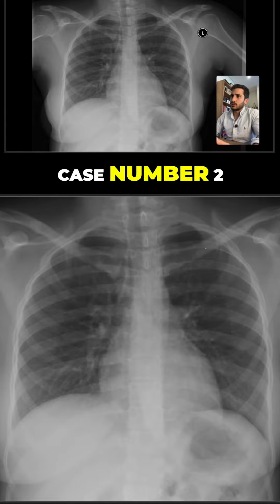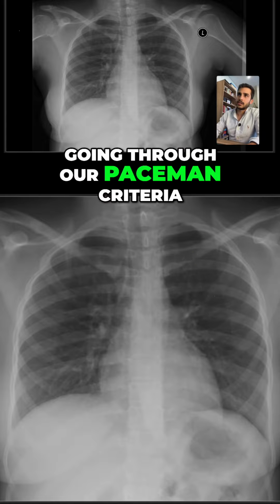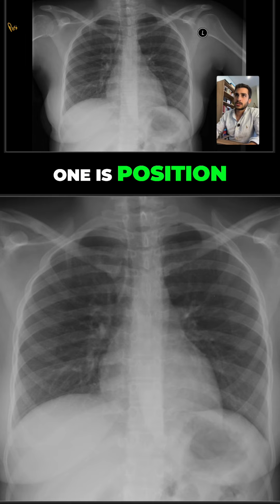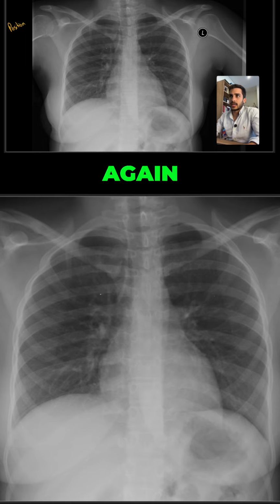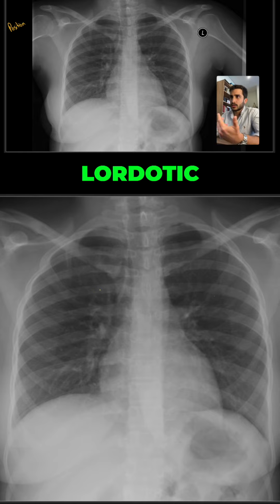Okay, so here's our case number 2. Again, a little bit different of an x-ray. Again, going through our PACEMAN criteria. So the first one is position. Okay, positioning, again, we're referring to is the patient rotated, tilted, kyphotic, lordotic, etc.